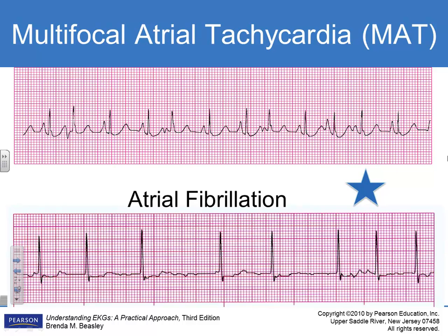This is multifocal atrial tachycardia. Look at those P waves. Every single one of these complexes has a P wave, doesn't it? Yes. Is it upright? Yes. Are they uniform? No. Multifocal, that means they come from different foci around the atrium.